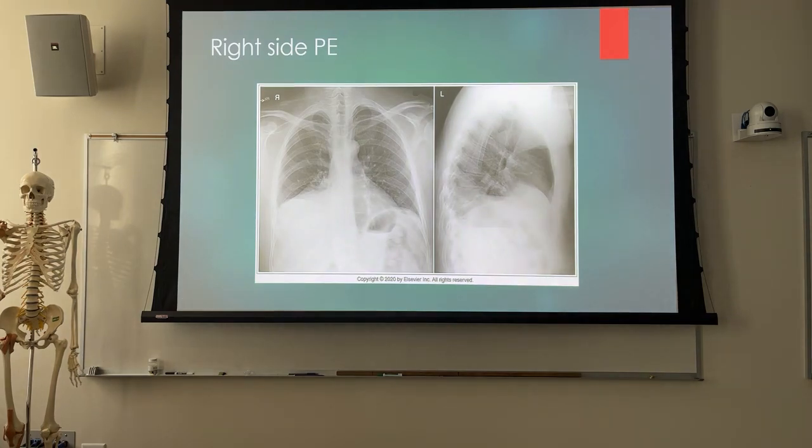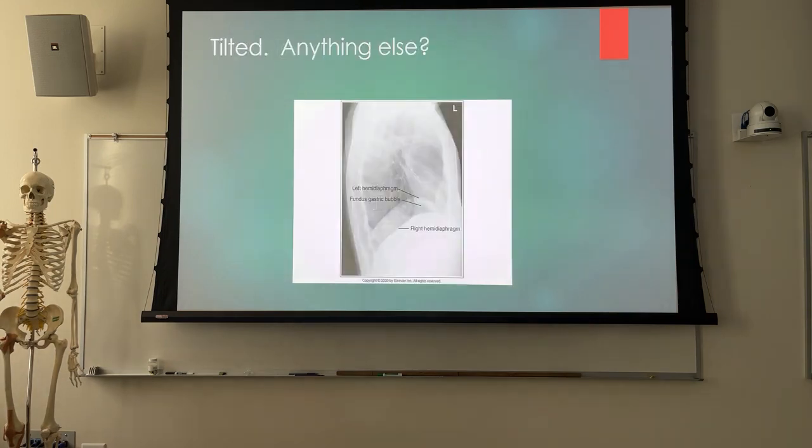Okay. So pathologies can also cause some problems. Now we get to our pleural effusion. Evaluate your PA chest. Again, we've got vertical separation, but the vertical separation is caused by this massive pleural effusion over there. You're not going to go back and have the patient positioned in a way that your diaphragm is going to be superimposed. Okay, so we got tilt here, right?